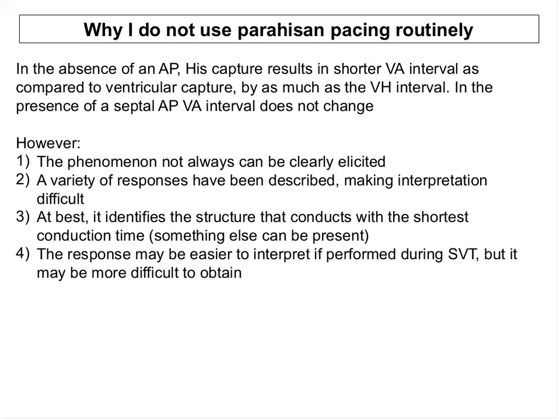Yeah, absolutely. A comment that I could make about that is that this is a dynamic maneuver. You have to stimulate always through the distal pair, and in case you wonder whether you are capturing the atrium, you only have to push the catheter forward and test it. Because in these examples you only have a fixed frame, but in the EP lab you can really make the difference by moving the catheter, and you can check it easily. Good. Okay.